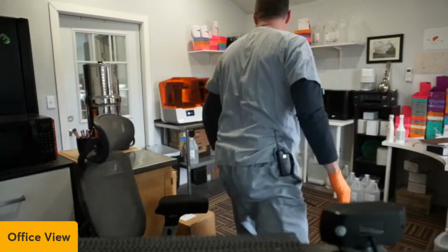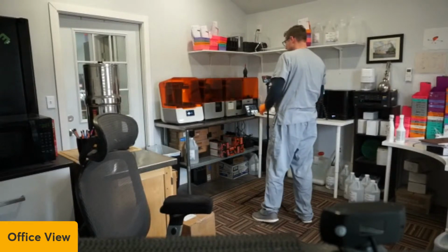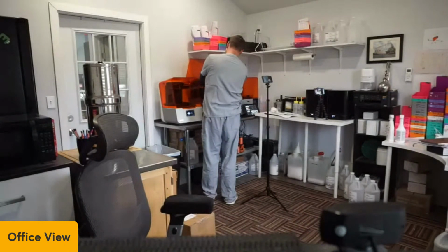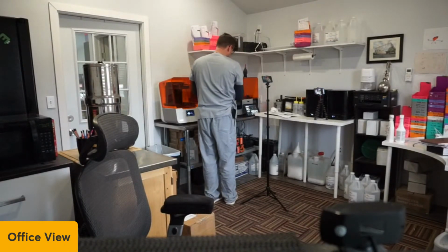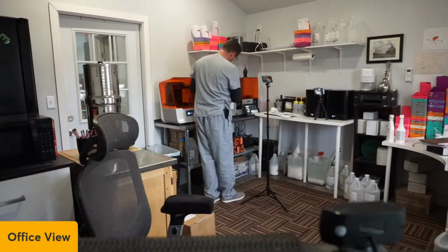So let me go back to here. All right. Let's work on this one, and I'll show you how the old way of removing these works. So I take this out. Now this is drained pretty good. It hasn't drained totally because it was at the wrong angle, so it was draining this way instead of this way. You can orient all your models.